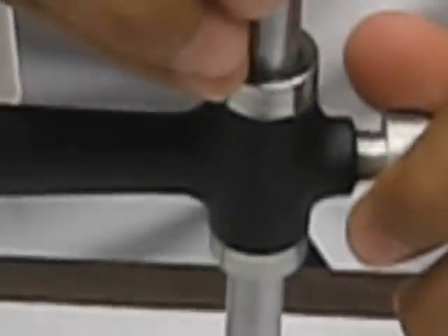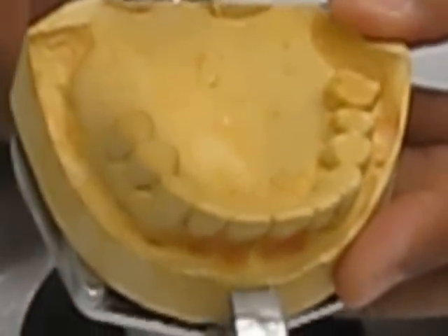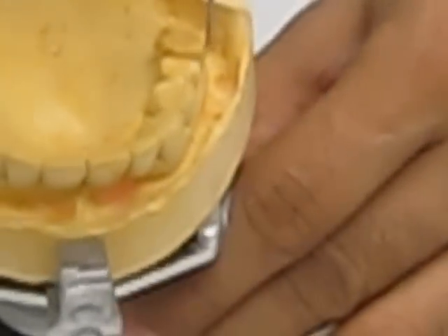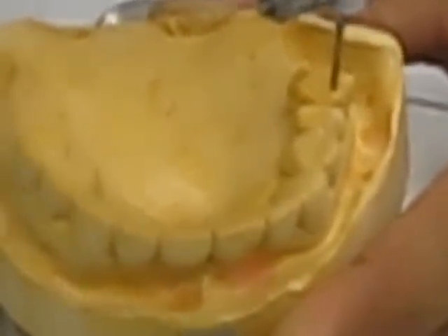First, we are going to identify the triangle of light. These are the areas of undercut. In order to find the desired position between 2 teeth, the triangles should be equal to each other, which is necessary to put the denture in position.